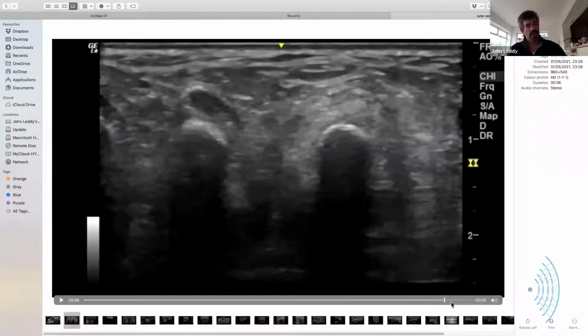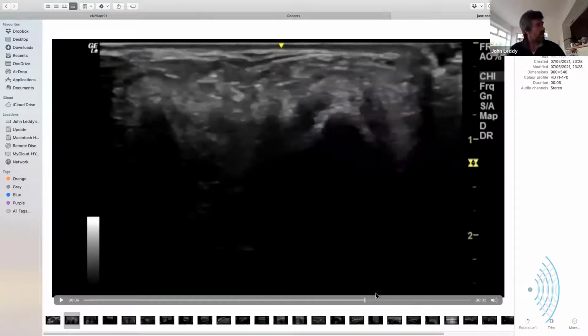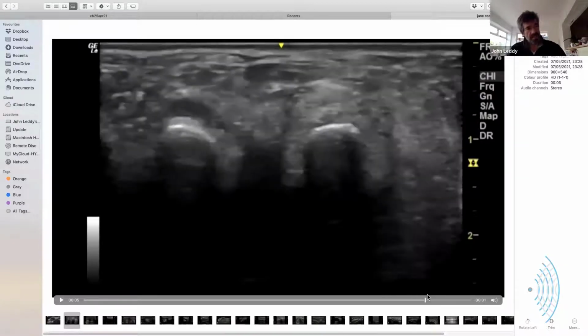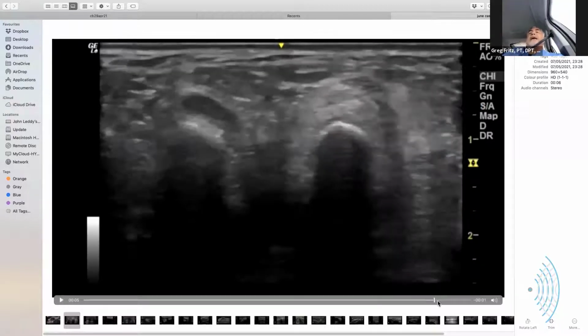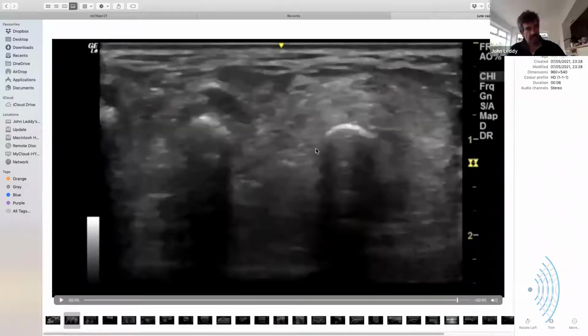When you scan through it, you'd miss it because of the big pathology you can see here in the joint. But actually, that could just be any old inflammatory joint change. This is something different. This ups the ante as to what is going on. Wow, that's really valuable. It looks like there's a cloudiness that surrounds it like a helmet around the whole region. Yeah, it suggests that the inflammation isn't just related to the joint, but related to the bone itself.